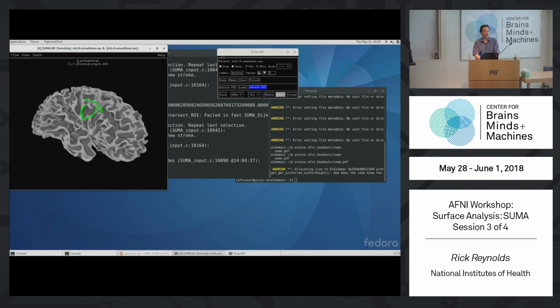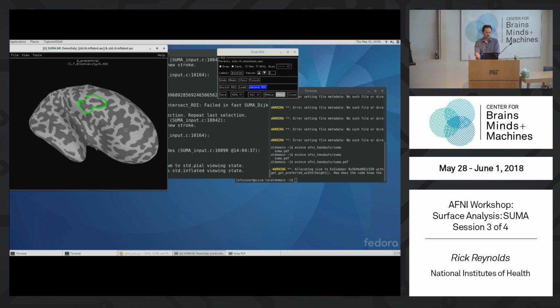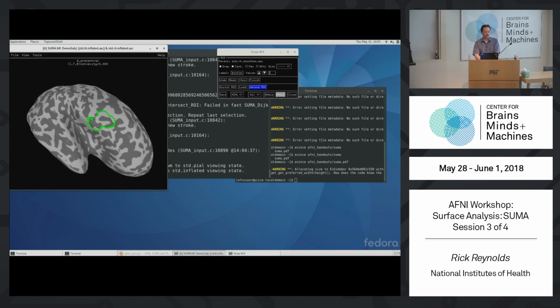Okay, so drawing on the surface is supposed to be easy. This is horrible. This is not a great view to draw in, right? You've got this 3D depth issue on this type of surface. But what if we hit a couple dots and look at this surface? Oh.